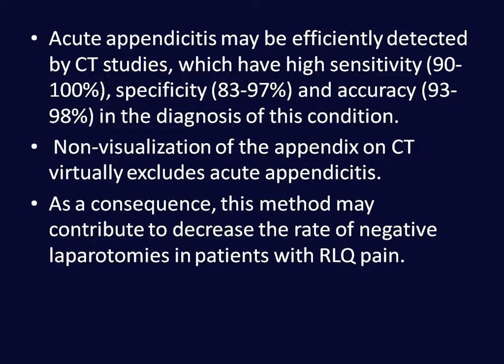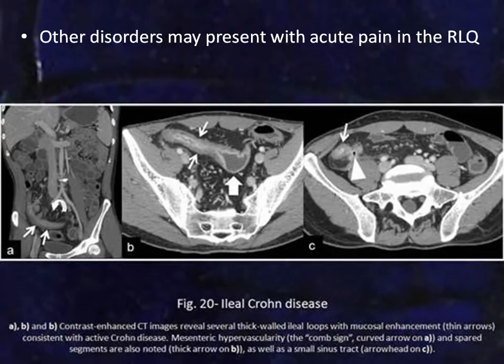good indication for a CT of the abdomen. Even you can do it without contrast. You'll still see the stranding, the thickening, the perforation, the appendicolith. All of these complications can be seen without contrast.